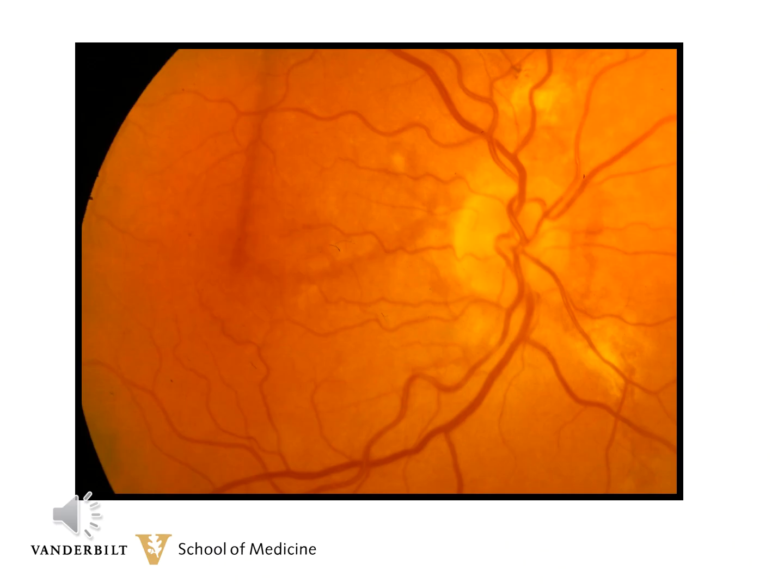This 64-year-old female was referred to me many years ago because she had blurred vision in the left eye for 1 month. The vision in the right eye was 20/20 and the left eye 20/200. On this clinical photograph, which was taken when she first came in, you can see one angioid streak extending from the nerve almost to the fovea. There's another circumferential streak nasal to the nerve, and there are two streaks, one above and one at 4 o'clock, which have some atrophy.